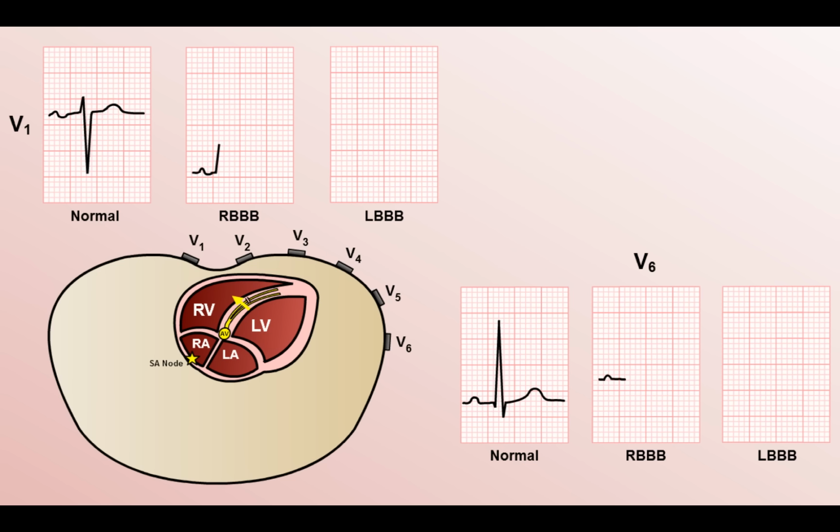The next event is unilateral depolarization of just the left ventricle. This is directed towards V6 and away from V1. What happens next is a slow and roundabout depolarization of the right ventricle via the periphery of the left ventricle. This results in a second positive deflection in V1 and a prominent terminal negative deflection in V6. Because depolarization of the right ventricle is inefficient and slow, as it's passing through non-conductive tissue, this final component of the QRS complex tends to be wider than the others, most evident in the wide terminal S wave in V6.